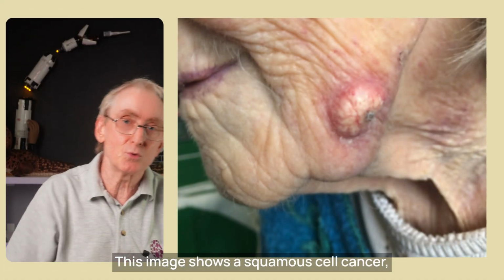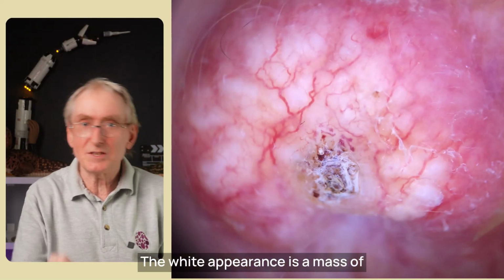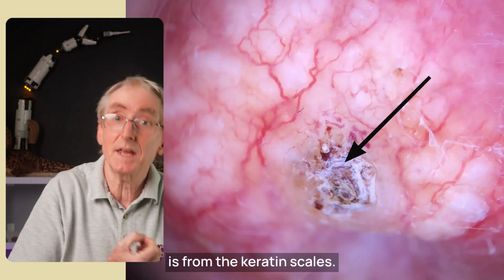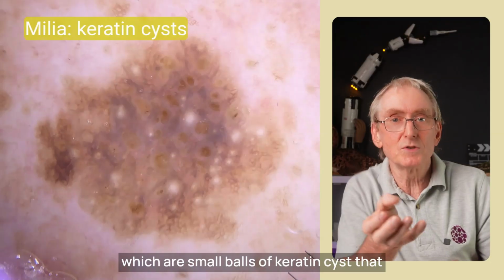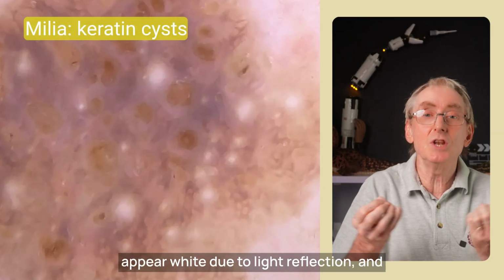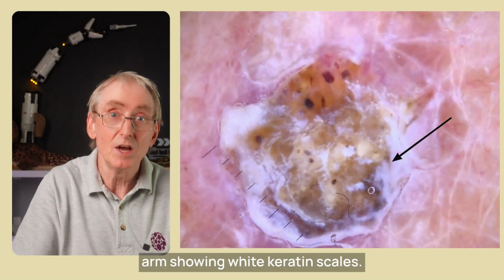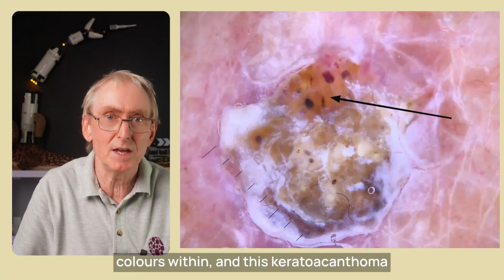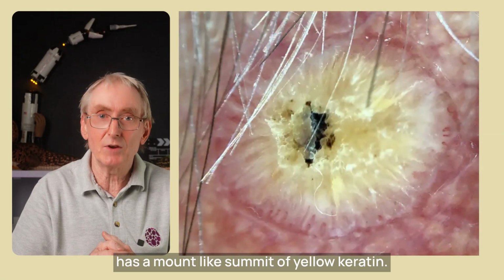This image shows a squamous cell cancer, which is a cancer of keratinocytes. The white appearance is a mass of keratin with a slight yellow tinge. The white reflection here is from the keratin scales. Other examples of keratin include milia, which are small keratin cysts that appear white due to light reflection. And this squamous cell cancer on the arm shows white keratin scales. The larger keratin mass has a yellowish tinge with some orange-yellow deeper colours within. And this keratoacanthoma has a mount-like summit of yellow keratin.